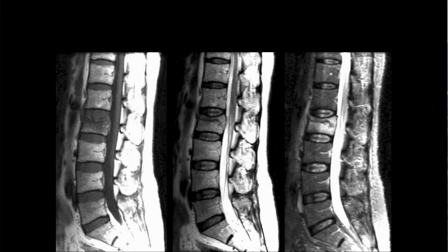And the main reason whenever you see these to evaluate that posterior cortex is that if you get a lot of bowing of it, that's a very poor prognostic factor that's commonly associated with malignancy. Here, this is very subtle. And what we see here is that the fracture line is very sharp. Almost always when you have a pathologic fracture due to tumor involvement, you'll get bowing of the posterior cortex, which is more prominent than we see here.